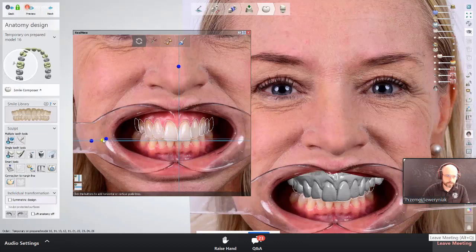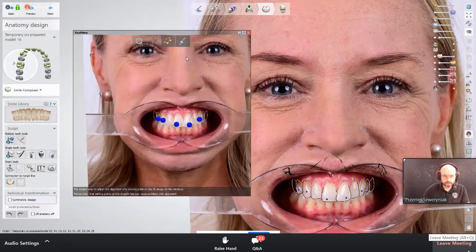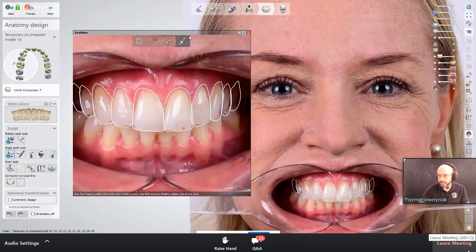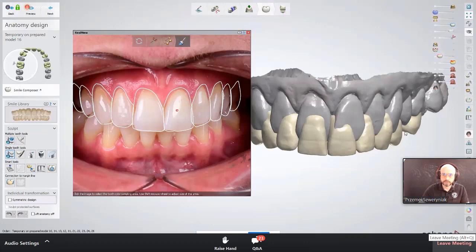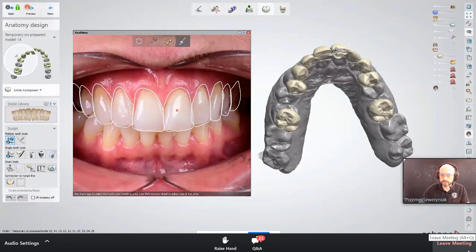I will also show you one more trick here while we're at it. Here in this step, the pencil step, if people don't know it, then what you actually are doing is changing the... let me turn off the picture and just move the full library a little bit so you can see what I'm doing.